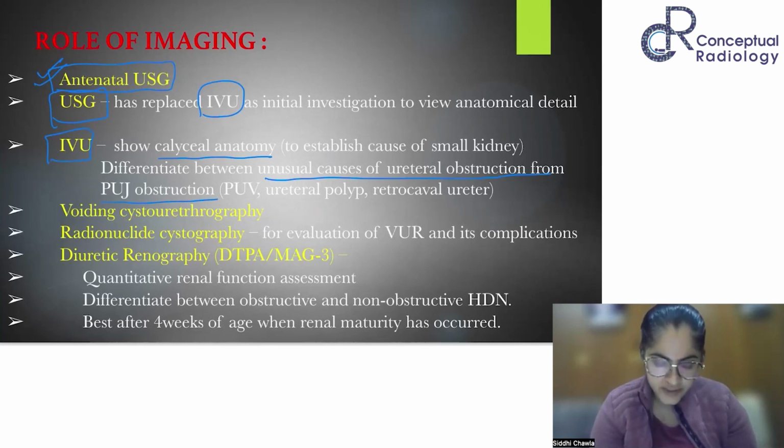The third investigation that all of you should know is the voiding cystourethrography. What does voiding cystourethrography mean? As the name suggests, the patient voids while we image the bladder and the urethra.